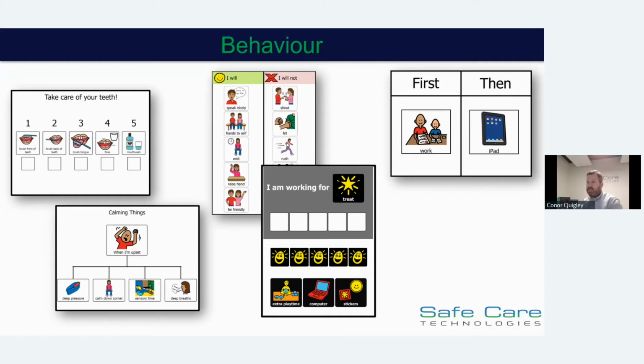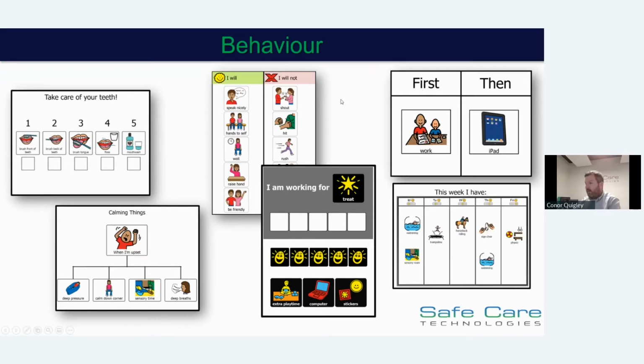We can use these PCS symbols to easily demonstrate and show somebody a support that we're trying to create in the classroom. So whether it's a first and then or an attendance bin or whatever it may be, we can create these. And I'll show you again between Boardmaker and TD Snap where we might use templates to create these quick and easy. So on a weekly schedule.